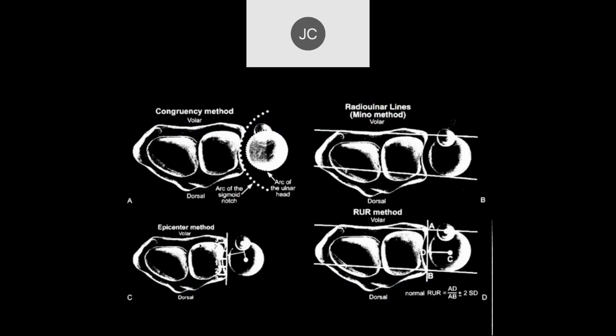So there were some papers looking at this. How do you call it? Distal radioulnar joint instability. Just remember that it's going to look different depending upon whether you're pronated or supinated. These are assuming a supinated image, and as you all know, I prefer to image the wrist with MR in the pronated position for the reasons we talked about before. And you can see the two arcs here, and they should be congruent. And when you get instability, you start getting separation from this.